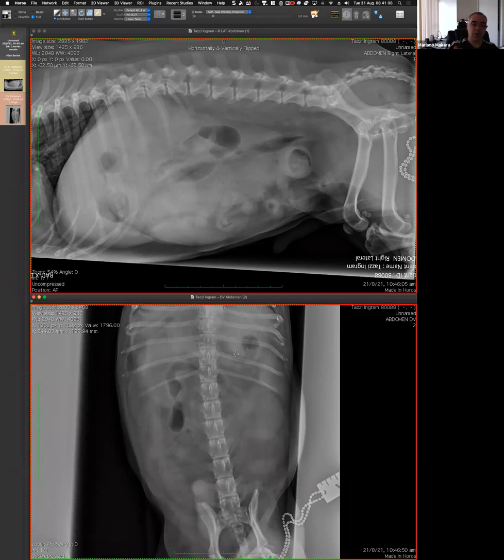Hopefully, the whole idea of spending time reading radiographs and spending so much time discussing just lines and ideas is that with all that knowledge, if you look at the image again, you can unfold and interpret those findings in a different way, and you have more tools in your toolbox next time you deal with a situation like this.